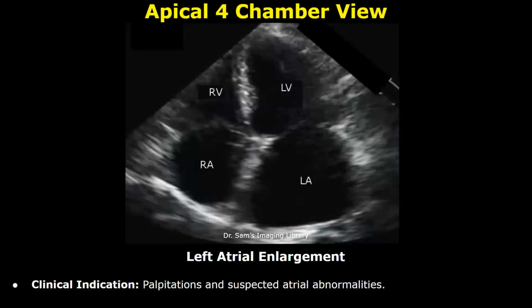Here is a case of left atrial enlargement. Clinical indication is palpitations and suspected atrial abnormalities.